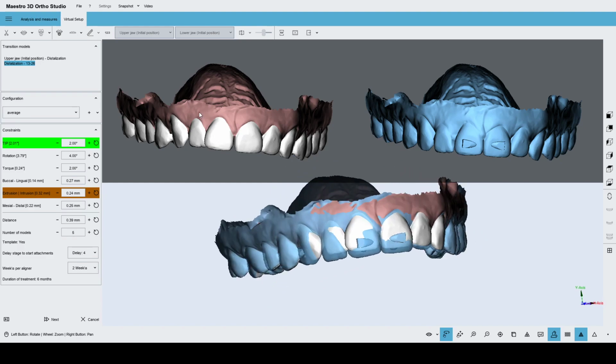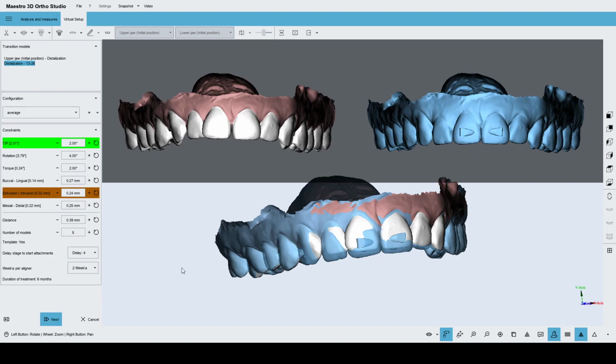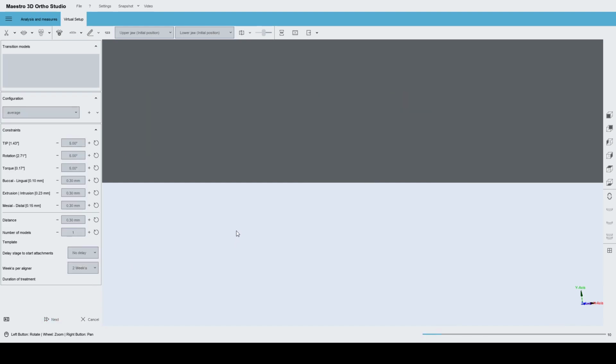After selecting my parameters and pressing next, the software shows me that there is a problem. In particular, let me show you again. There are 2 movements that exceed, 2 values that exceed the maximum allowed. So the software also gives me some warnings when I do the movements. Pressing next, at this point, I have finished my preparation of the models.